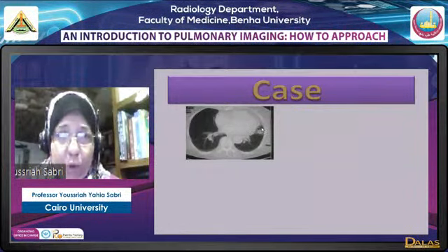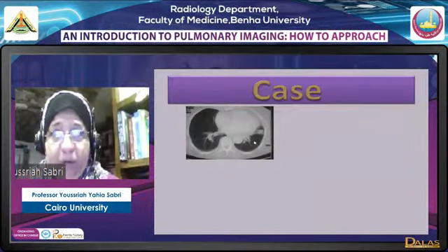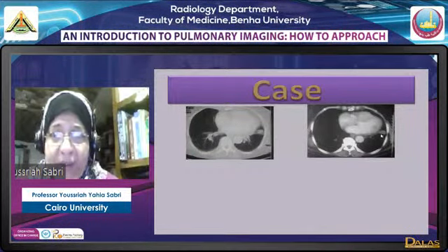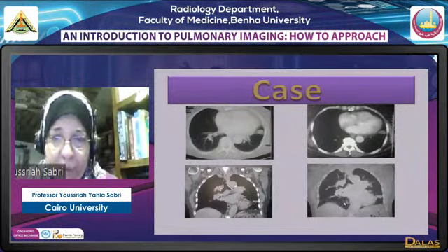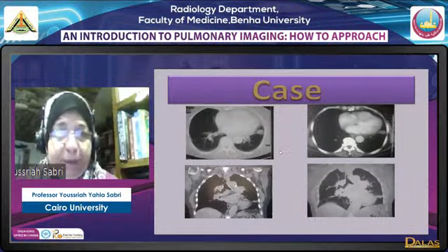Again, a case showing a nodule in the lower part of the left lung. Tissue characterization, mediastinal image shows fluid density. Multiplanar imaging shows that this is the site of the fissure, and this is only fluid, in the coronal image. Again, tissue characterization, multiplanar images.